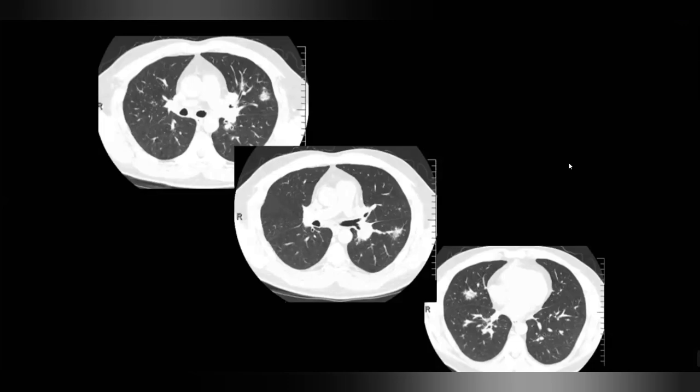You will not see TB like this. And since these nodules are not surrounded by ground glass haze, I wouldn't favor invasive fungal infection. But still, fungal infection is a possibility even without the ground glass. So fungal pneumonia should be on top of your differential diagnosis in addition to Kaposi sarcoma.